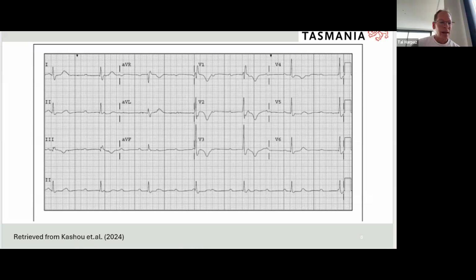I've been using the 300 method. I think it's a quick one. 300 method from Tal. Do you mind explaining that, Tal? Yeah, so I just count the blocks. Each block is 300, so if it's 2 blocks, it's 150. 3 blocks, it's 100. 4 blocks, 75, etc. So 300 divided by the number of big blocks. Perfect. Assuming it's regular, yeah. I was going to say, if it's an irregular rhythm, that's going to be a hard one to use, isn't it? Yeah.